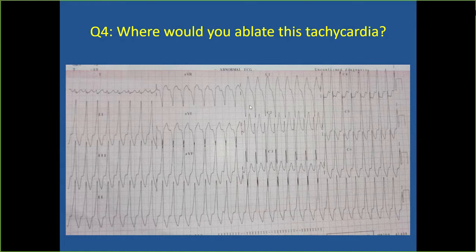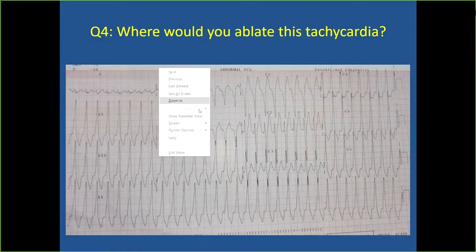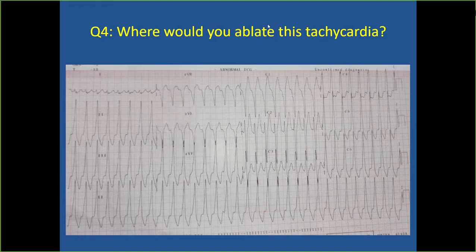See this P wave here? Compared to these, there is a P wave here. If you want to see in lead 2, there is a P wave here. Can you see that? This is an AV dissociation. So it's a relatively narrowish wide complex tachycardia. Means it is coming closer to the septum. There is a VT with inferior axis.